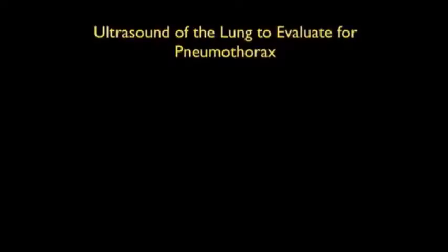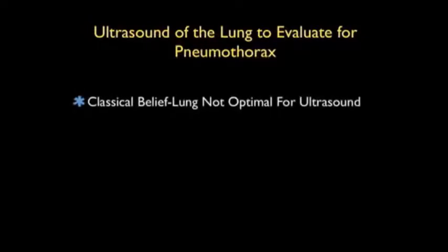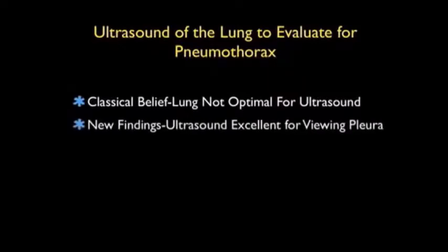In this module, we're going to look specifically at ultrasound of the lung to evaluate for pneumothorax. Interestingly enough, a classical belief was that the lung was not optimal for ultrasound imaging. However, newer findings have shown that actually ultrasound is an excellent modality for viewing the pleura and for detecting pneumothoraces.